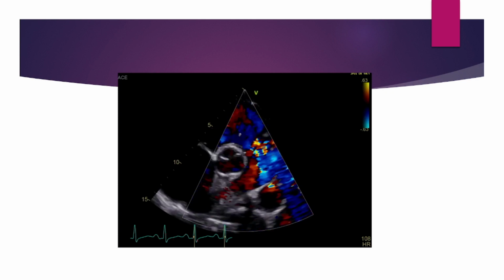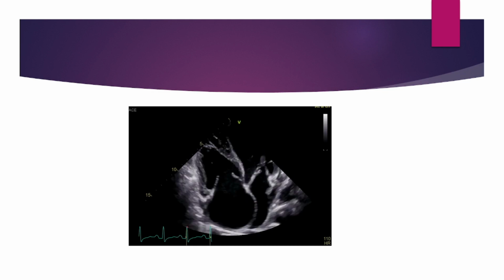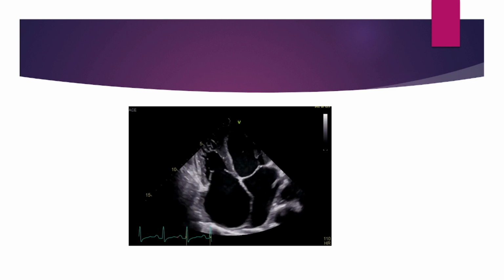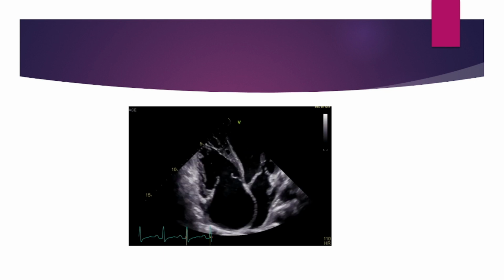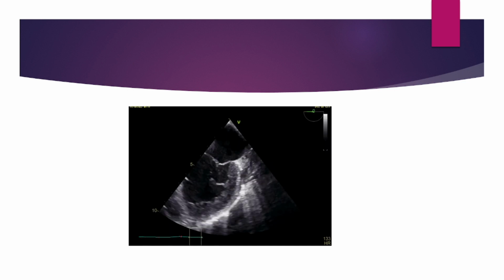So this is bilateral endocarditis secondary to the shunt, and the vegetation can be seen also on the patent ductus arteriosus. So this is the four-chamber view, showing bowing of the interatrial septum with moderately impaired RV and moderately impaired LV. And here you can see the continuous murmur with patent ductus arteriosus.